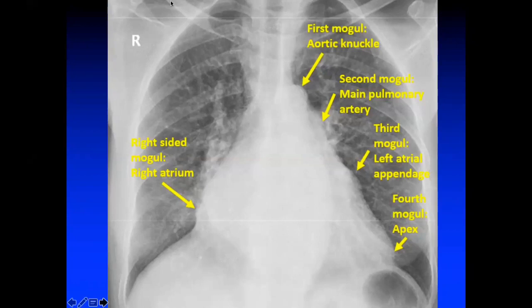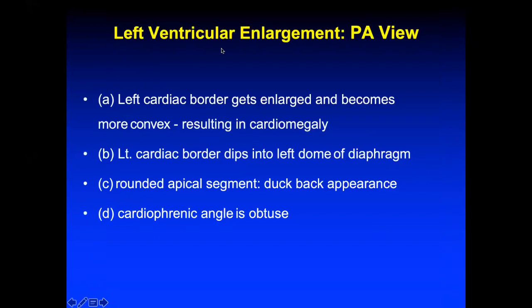So after doing the left atrial enlargement criteria and right atrial enlargement criteria, let's go on to the criteria for left ventricular enlargement.